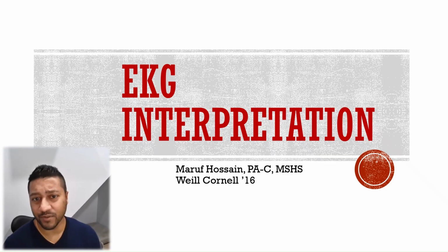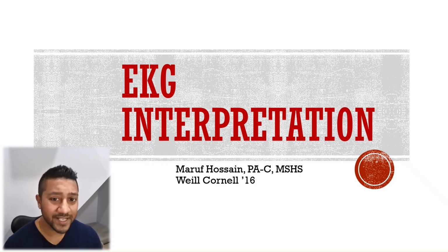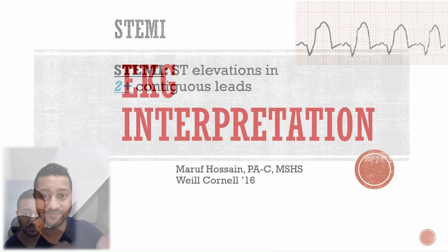Today I wanted to talk to you about a very high yield topic for the PANCE boards, and that is EKG interpretation. Now, EKGs can feel pretty overwhelming, but board exams only test a handful of EKG patterns. So in this video, I'll review the most common EKG patterns that you need to know for the boards, and then I'll show you a quick and easy way to tackle EKGs that's useful for both the boards as well as for clinical practice. Let's jump right into it.